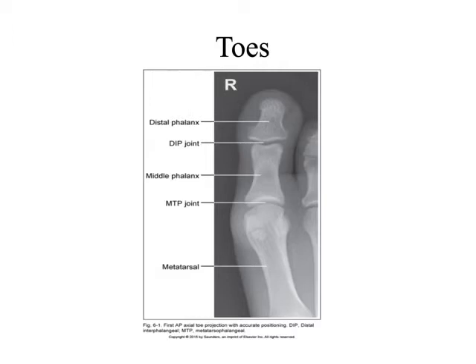Now, what's the advantage for you, right? The advantage is simply this. If you can describe how these images were produced, then you can probably tell me a little bit about how the patient was positioned, right? So there is a way, if we know this stuff really well, to think back to positioning as well, to learn something about positioning while we're doing this kind of work.